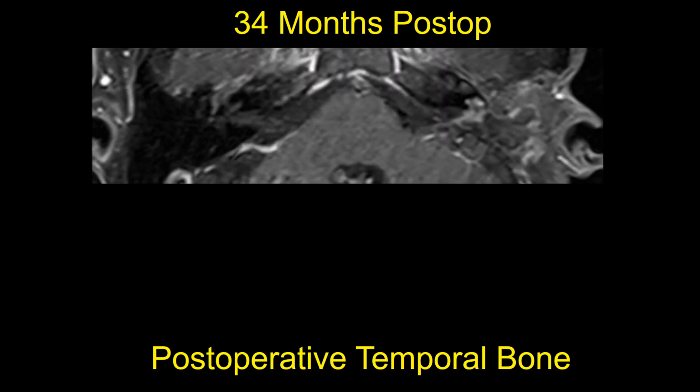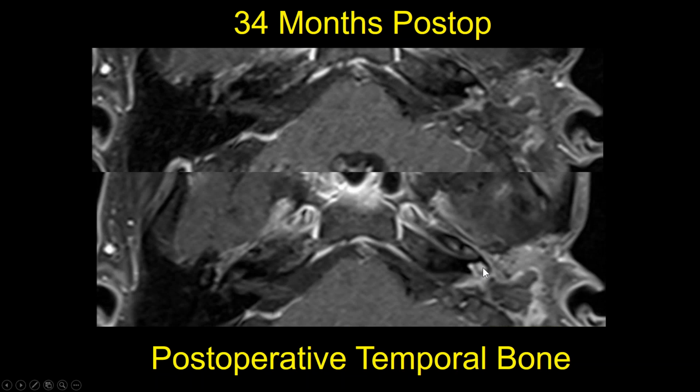In this case, we had very avid enhancement within the basal turn and the apical turn of the cochlea from these postoperative changes from breaching the otic capsule, the dense bone that is around the cochlea and vestibule.